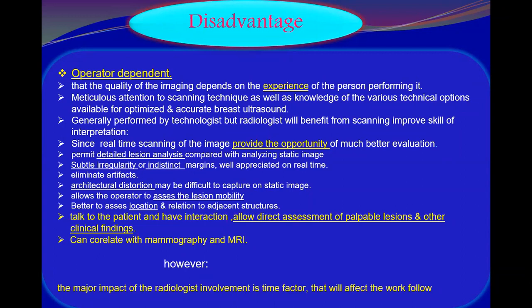Generally, breast ultrasound can be performed by a technologist or radiologist. However, it should be interpreted by the radiologist. But it is preferable for the radiologist to perform breast ultrasound.